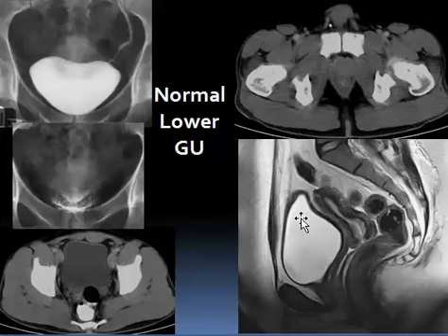This is the bladder in MRI and the relation of the bladder to the uterus and to the vagina, and here is the pubic bone, and this is of course the sacrum. Here is the ischiorectal fossa on each side, and this is the region of the urethra passing within the prostate.